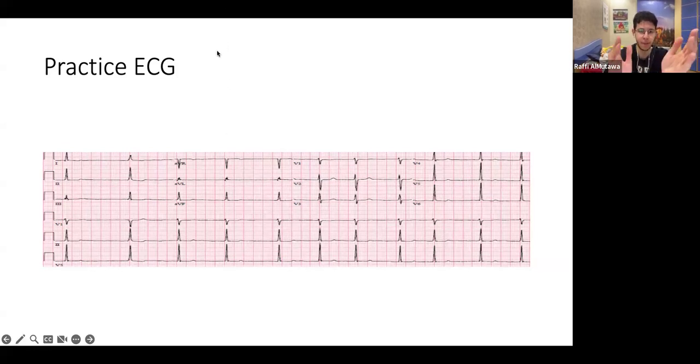Okay, correct. AFib. Good job. This is atrial fibrillation. Yes, you do, in fact, deserve to say yay. So you look at it and it looks irregular. Okay, it's irregular, probably a tachycardia. If you count the rate, 1, 2, 3, 4, 5, 6, 7, 8, 9, 10, 11, that means 66. Okay, wait, something's wrong here.